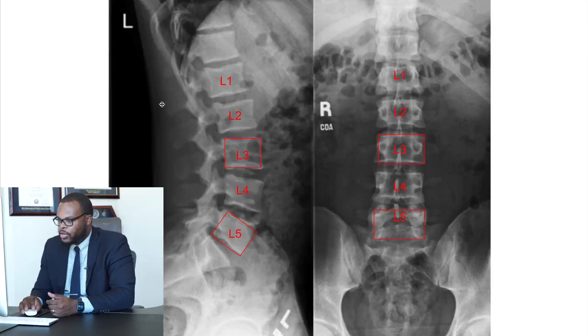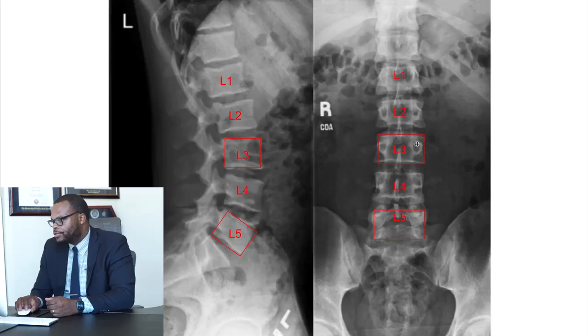You can see here that all of the shapes of these bones are pretty square, nice and square. We have our spinous process, which are these prominent areas back here. And if you feel along your lower back, you can feel these spinous processes. You have your transverse processes here on both sides. We call them the TPs. And this is something that we look for in surgery, actually, when we're placing pedicle screws. These are the pedicles here, these little dots, pedicles, 2 at each level, and then transverse process. So this is the anatomy that I look for when I'm placing screws into the spine. I'll look for the transverse process here, and my goal is to try to put a screw right into that pedicle so it ends up in the vertebral body here.